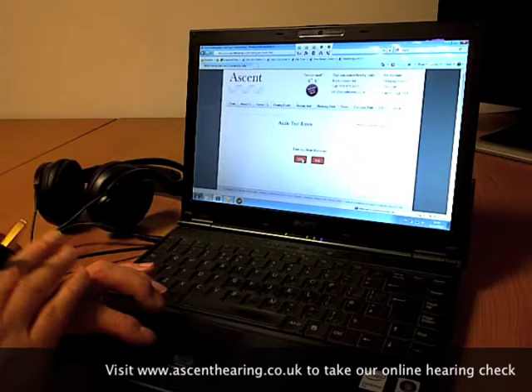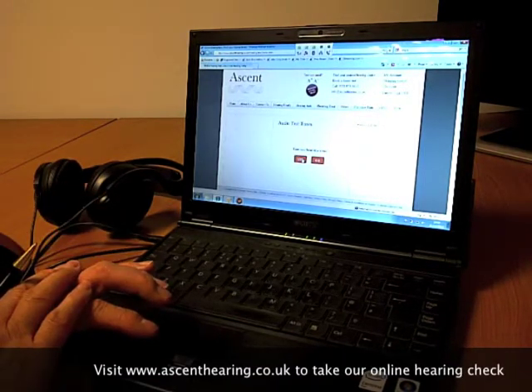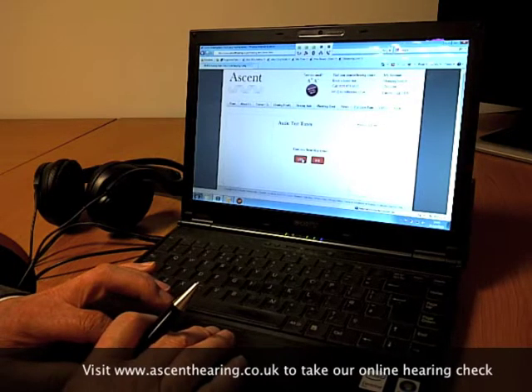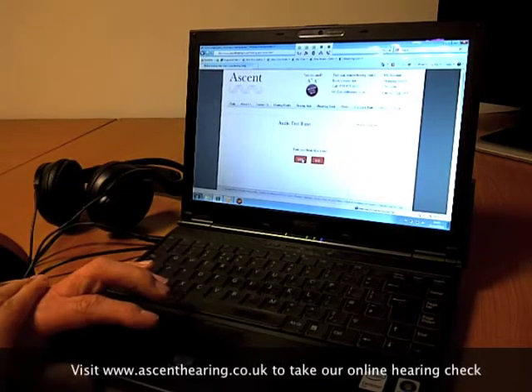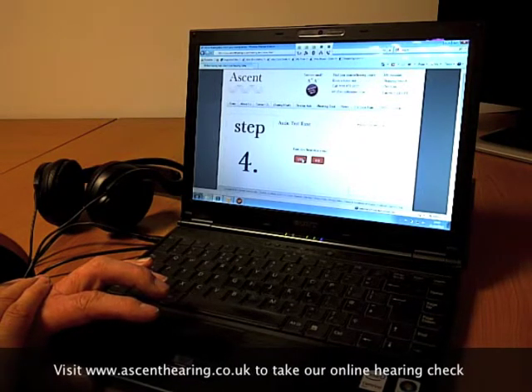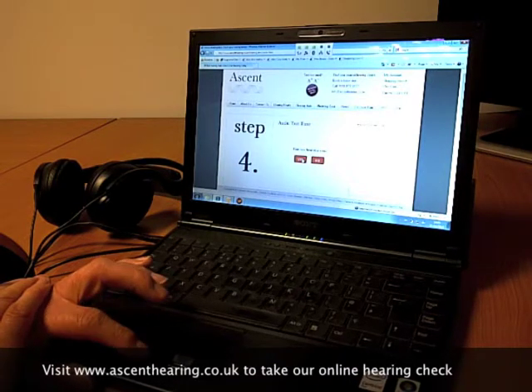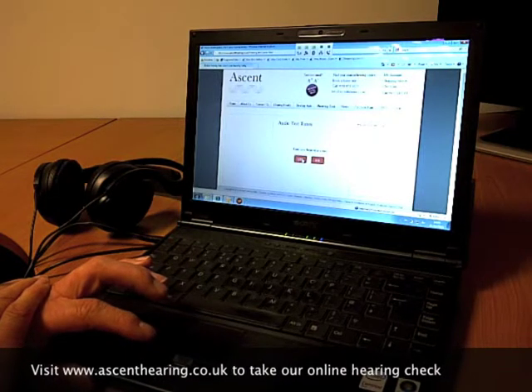Now I'm being presented with a new tone. It's a higher pitch tone, and I have to click whether I heard that one or not. And I'll click yes, I heard that one. Now I've got my third test tone. There are 4 in all, and basically I'm waiting now, and here it comes, a higher pitch signal. And again, I click whether I can hear it or not, and I'll click yes, I heard it.